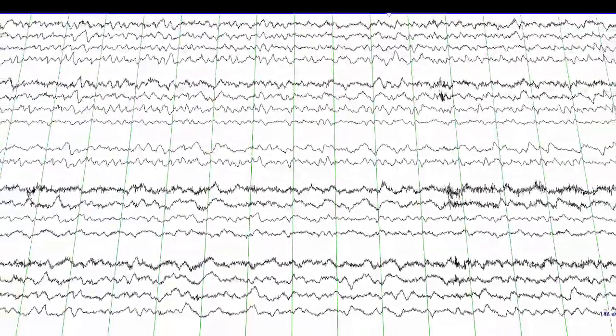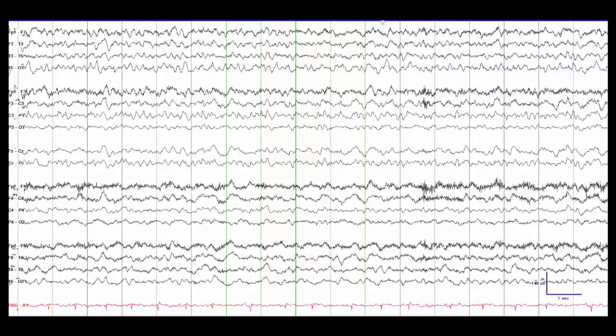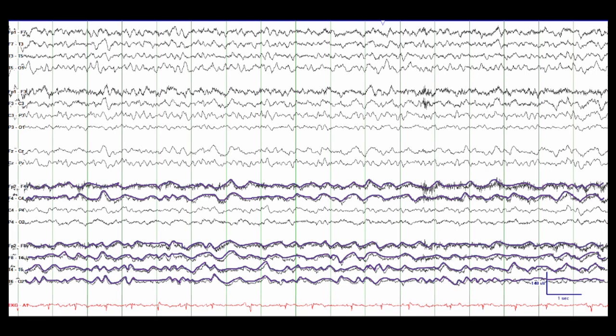Focal slowing within the EEG is one of the more difficult features to recognize. The oftentimes subtle tracings can be better appreciated when considering a few key points. First, identifying focal slowing via contrasting homologous regions, for example, the left and right temporal chain, is very helpful.